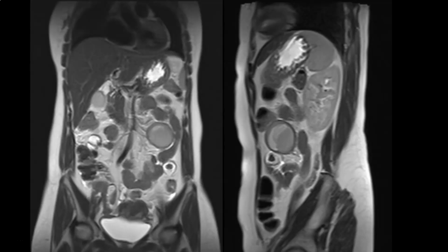To answer this question, MRI has been performed, hoping that the lesion may show some degree of mobility between one sequence of images and the other. But in fact, the lesion has completely moved from the right, as it was on CT, to the left on the MRI, which proves its mobility and proves also that it is mesenteric rather than retroperitoneal. And the presence of small intestinal loops posterior to the lesion definitely excludes its retroperitoneal location.